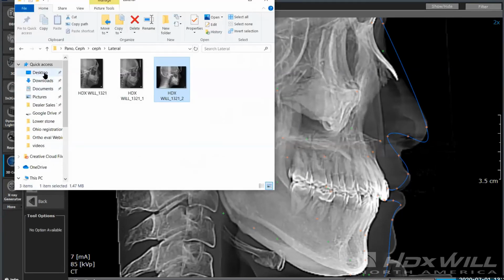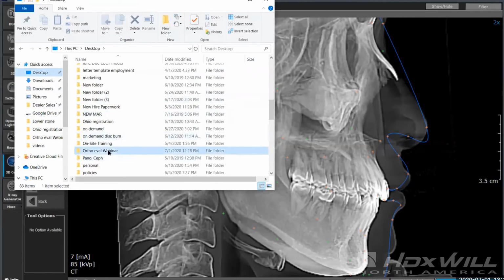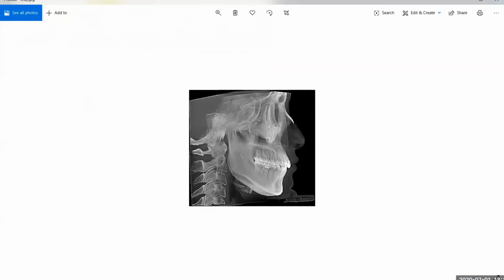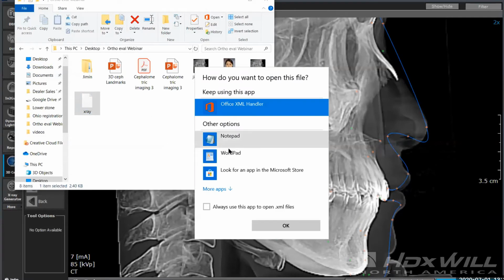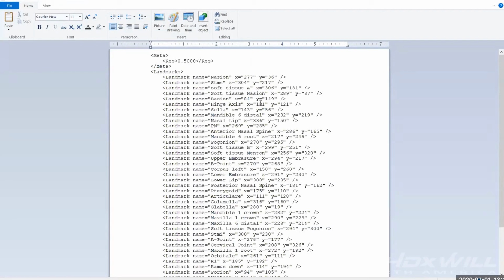and now not only do you have the X-ray that we've created, but then we also have, I'll just open it in WordPad, all the different analysis points along the way. So again, you have the ability to take this out.